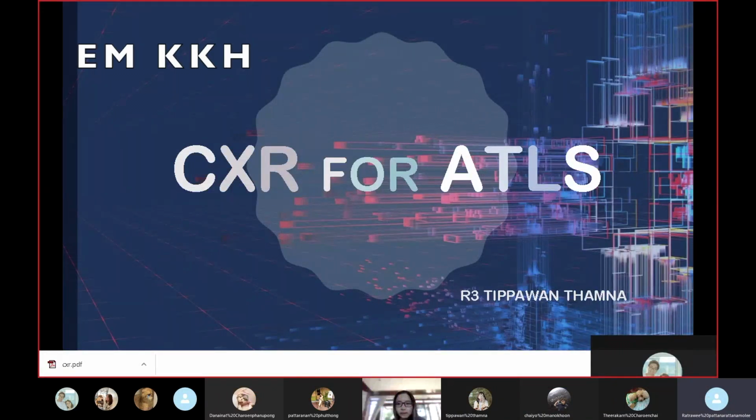ATLS examination in the next month. This is the reference for the ATLS book.